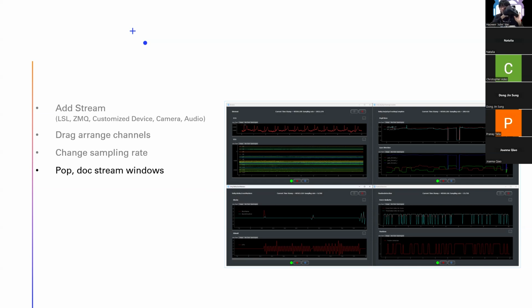So you can see it right here. That's a Varjo headset, and inside this Varjo headset, there are eye trackers behind it. And we also have the event markers from Unity. And on the bottom right, we have the real-time fixation detections from the scripting interface, which we will further explain maybe in 20 minutes.